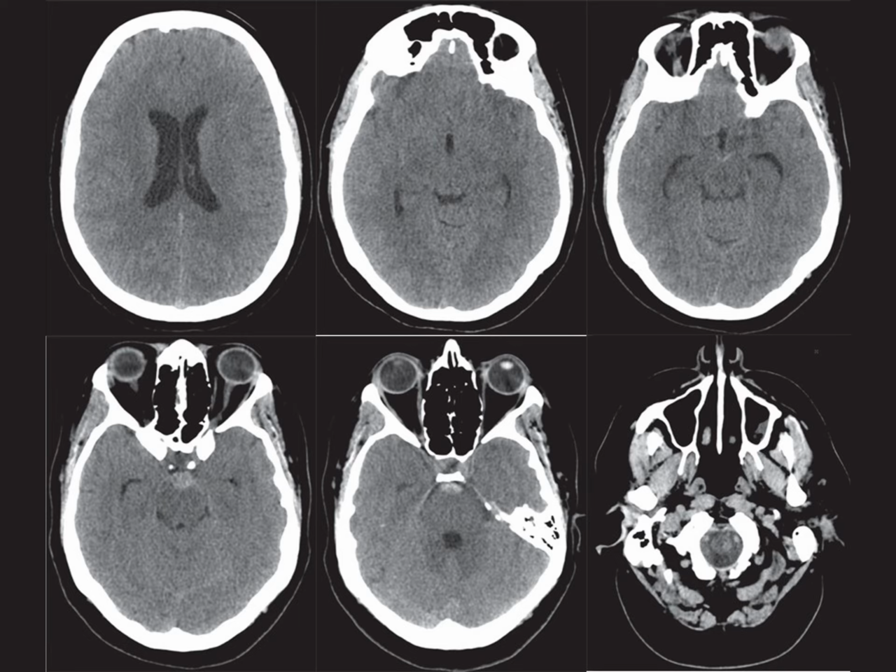Today, I'm examining a series of selected axial images from an unenhanced CT scan of the brain. These images provide a comprehensive view of the cerebral structures. The cerebral volume appears to be well preserved, suggesting that the patient is likely a younger adult.